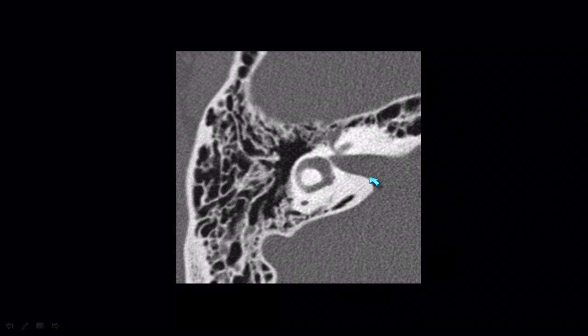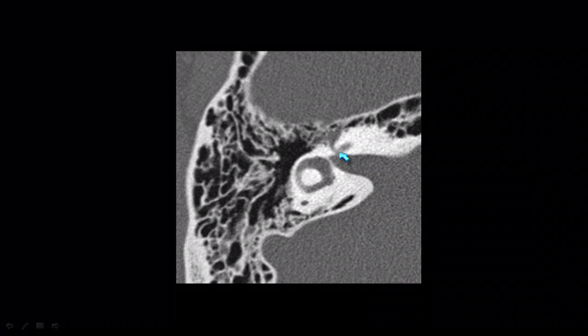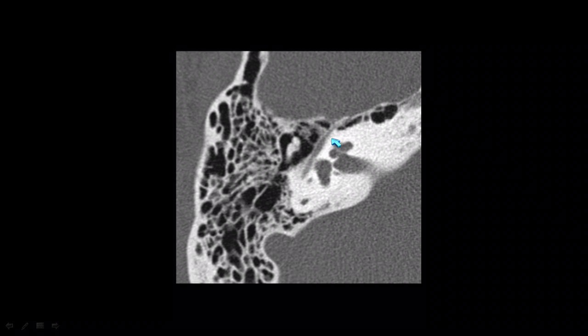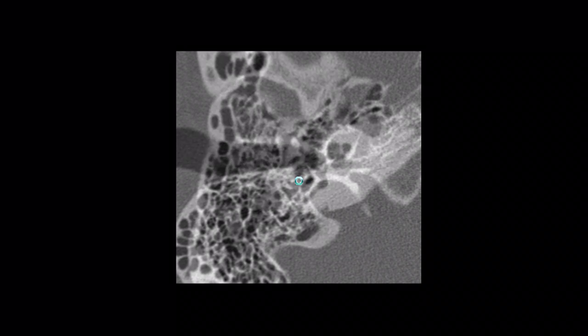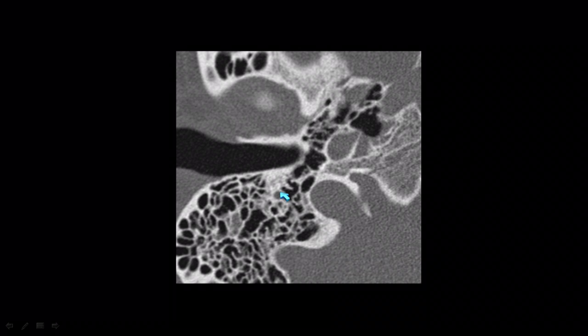So then on CT, we're going to see the intraosseous segments as we go through. We have the little tiny labyrinthine segment going forward through the labyrinthine part of the ear. It's just 4 or 5 millimeters going anteriorly. Then we have our anterior genu and the tympanic segment, which is about 1.5 centimeters. That tympanic segment goes back just under the lateral semicircular canal. Then we have our posterior genu, the posterior turn. And then we have our descending or mastoid segment, where it looks like one mastoid air cell is opacified, extending down inferiorly, posterior to the external auditory canal.